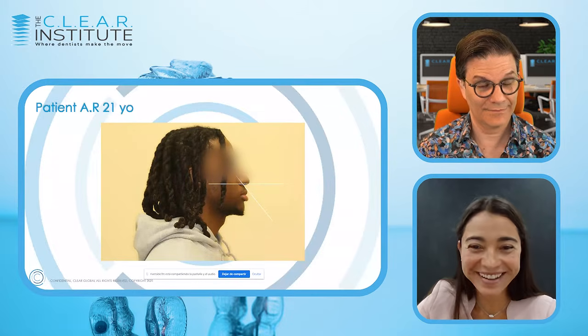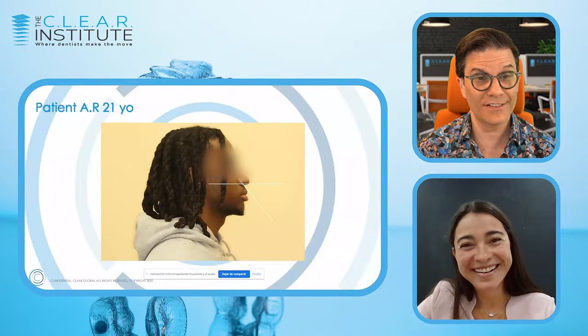So the nasolabial angle is... Everything goes down, Adriana. Everything goes down, but your nasolabial angle will go down first. That's it. Yeah.